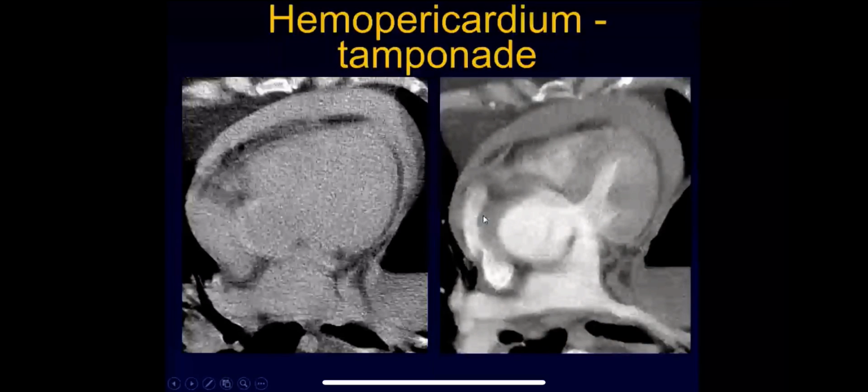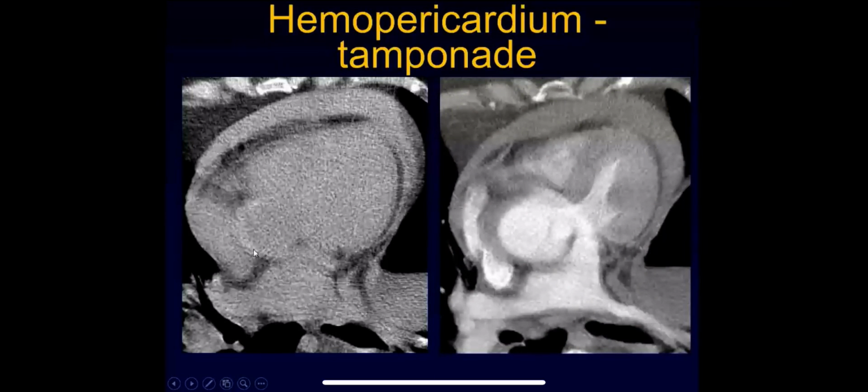Here is a patient who has an acute intramural hematoma, which is treated similarly to an acute aortic dissection involving the ascending thoracic aorta. This is Type A, which has led into a hemopericardium. This patient was taken for surgery.